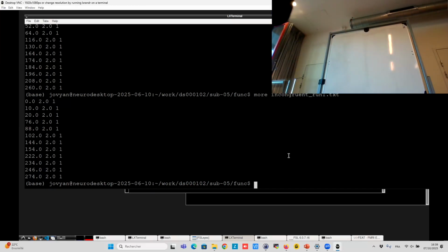Now what we want to do is to correlate the BOLD signal with these stimuli. The second step will be to put the HRF, the hemodynamic response, in it. It will do that automatically. It will take the location of your stimuli and model the signal based on the HRF, and try to correlate that with your whole image. Is it clear? So you will do just a correlation between that, modulated by the HRF, over to the signal you want to get.